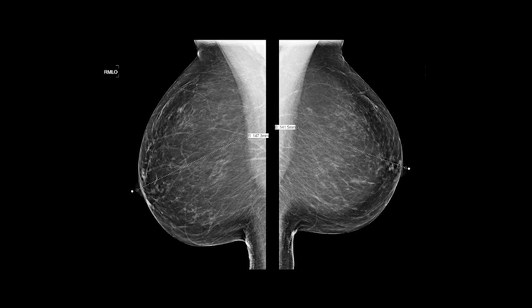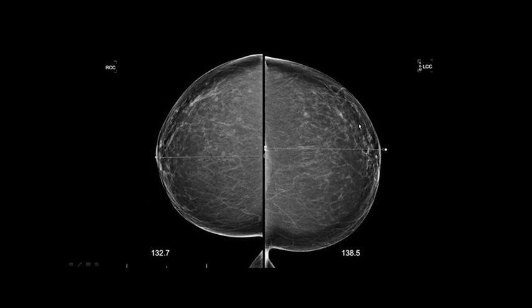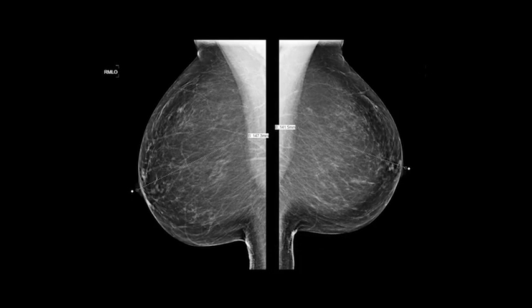Now let's look at the positioning on this case. There's a little fold laterally here. They don't want to see any folds. The nipples are perfectly centered. I like that. But you could tell on the right also it's very hard to see if you got good medial tissue compared to the left breast. So I would have definitely redone that right side if I was turning it in.